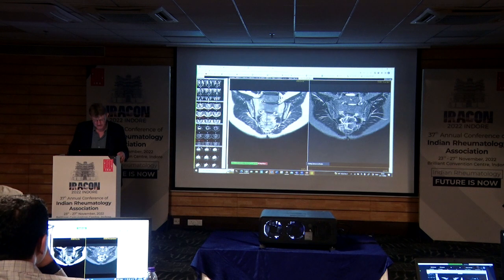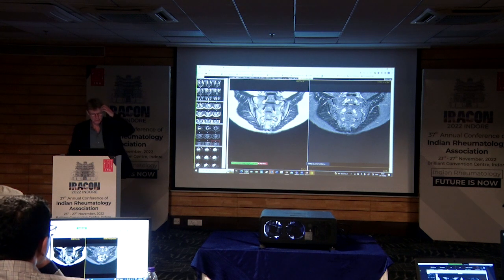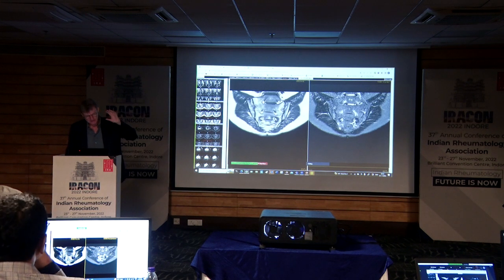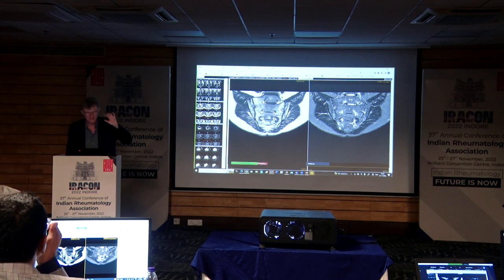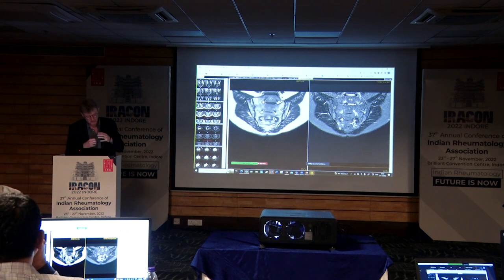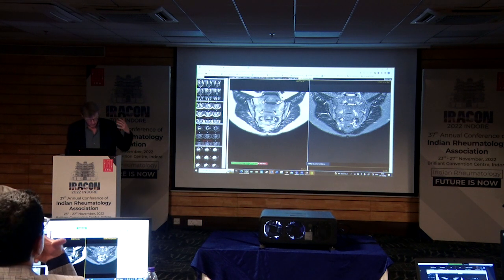But when you go into the next slide, oh, that's the wrong direction, next slide here, then you'll see that you're inside the fibrous compartment with the bright signal of the fibrous compartment, both here and here. And therefore, this may be just what we call partial volume artifact, that there is a bit of the ligamentous portion and a bit of the cartilage portion in the same slice, which is 4 millimeters thick. And thereby you get some blurring, and the signal looks a little bit different, a combination of the two tissues. And there we should be conservative and not score it as erosions, because we'd rather underestimate than overjudge.